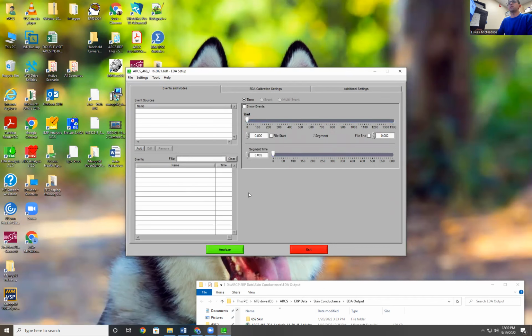Alrighty, so now the data file is loaded, but we need to load an event file. More likely than not, the event file will be already made and converted into the Mindware format. The format that we generate the raw file from is too complicated for Mindware. It only needs a couple different pieces of information, so it needs to be simplified. But that is usually done.